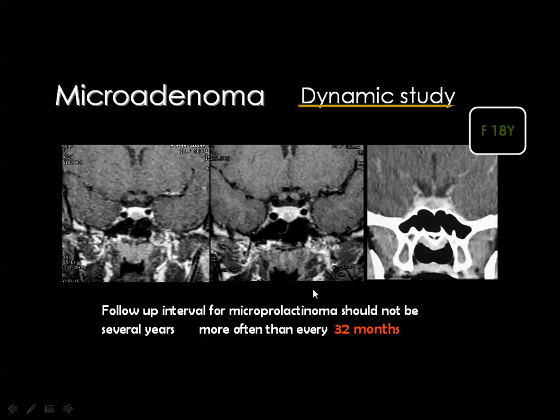And then sometimes the microadenoma does not cause a pituitary surface bulge, because the microadenoma is located near the sellar floor, and this was sometimes considered a sign of pituitary microadenoma whenever you see homogeneous enhancement of the pituitary gland and a depression in the sellar floor, which may be related to the site of the pituitary microadenoma.